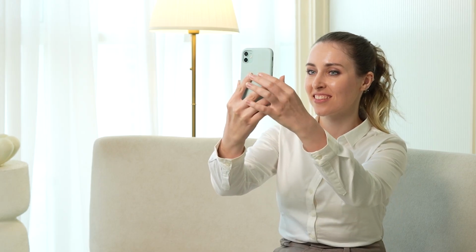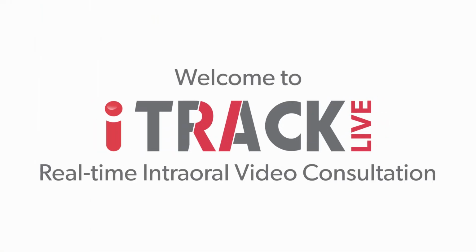Discover a smarter way to stay connected with your dentist anytime and anywhere. Welcome to the How to Use guide of iTrack Live, the AI-powered real-time intraoral video consultation facility of Illusion Aligners.